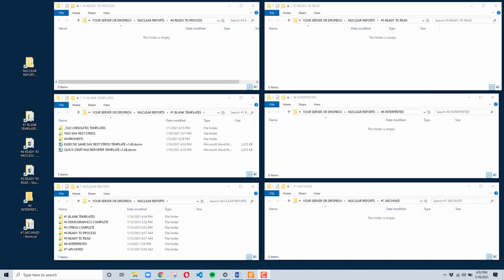So first, I just wanted to go over what the NucReporter is. It is really just a collection of Word documents that have embedded programming in them. I was the technical director of an IAC accredited lab for 11 years.